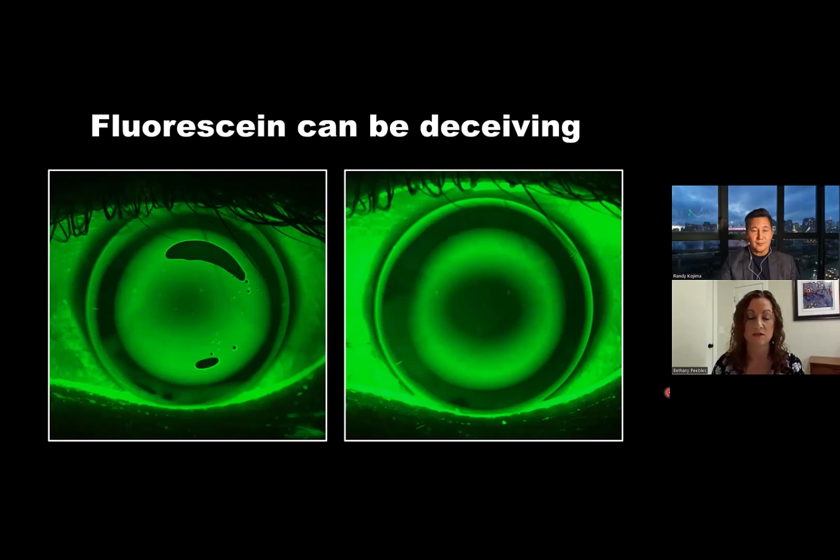Now, that doesn't mean you're not going to need to make changes. That doesn't mean it looks textbook. Honestly, most of the time, they don't look textbook. I mean, we always use these beautiful looking ortho-K patterns in fitting guides and in lectures and whatnot, but there's always going to be, like you said, maybe one side looks a little thinner than the other. Maybe it's shifted one way, it's sitting down a little bit. Those are not things that we get hung up on.